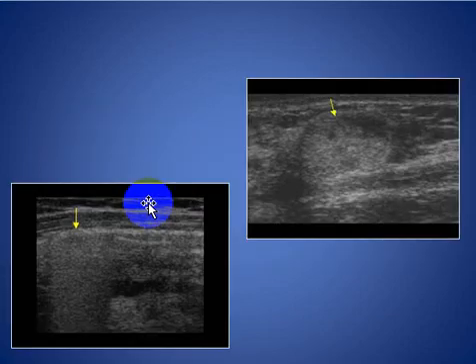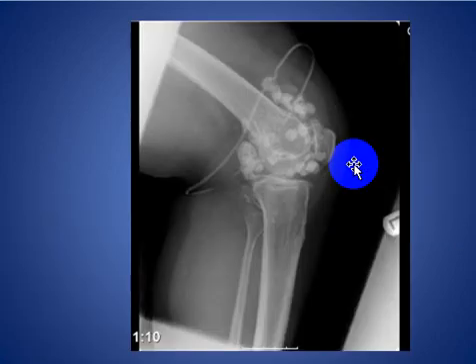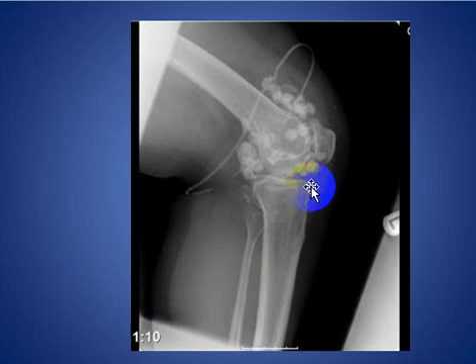Here, this patient with silicone contains silicone particles, and here this is a ruptured silicone implant giving the appearance of a snowstorm. As we see here, and this is the rupture outside, and this is the contained silicone here in another example. Here, a patient with synovial chondromatosis giving the appearance of the snowstorm.